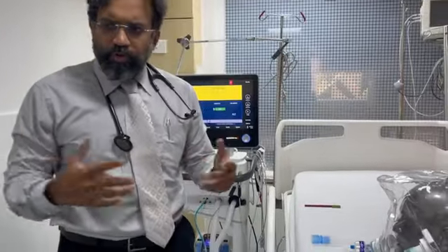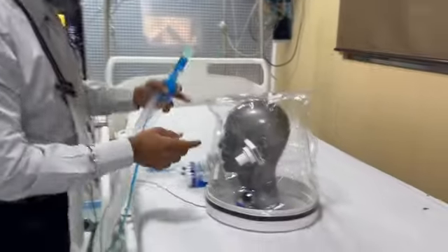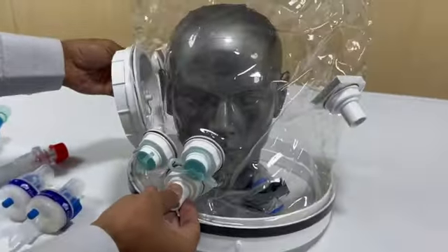If there's a leak, it has to increase the force higher and higher, whereas here even if the patient breathes heavily, it will still accommodate because it has big compliance and big air. We also have certain helmets with a third attachment. This is one of those helmets. If you look at this, it's got one port here, one port here, and another port here. There are three ports over here.